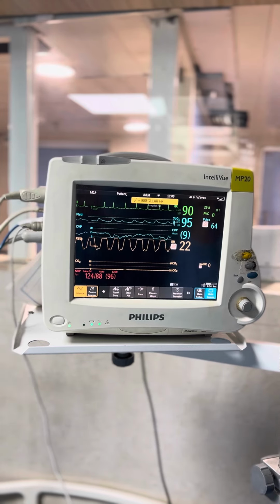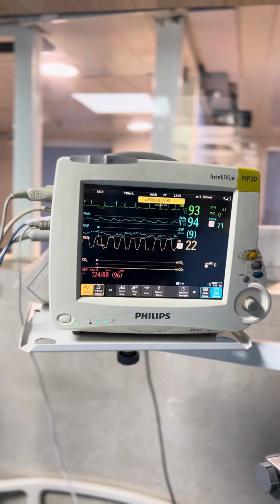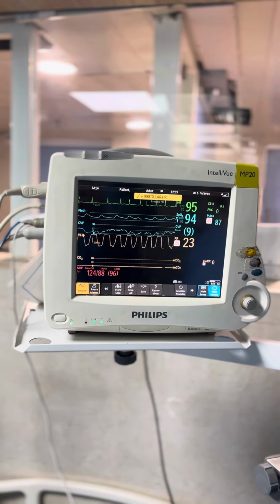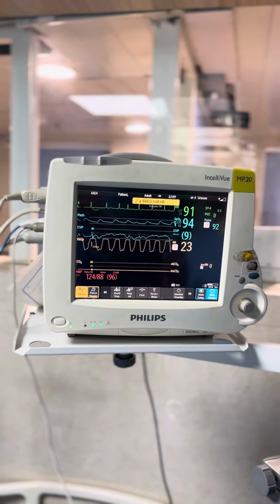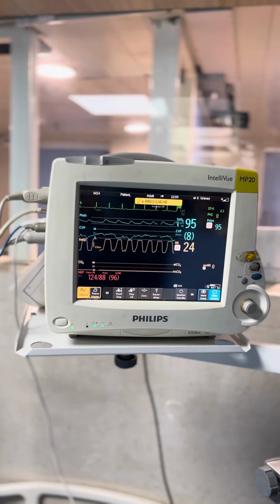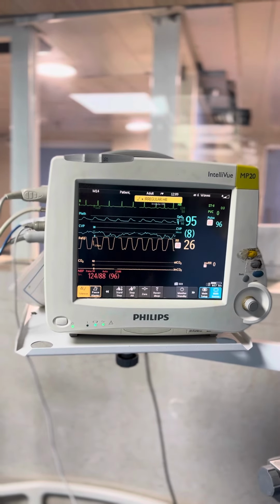In the previous ECG, we just talked about a normal ECG where a regular rhythm is there. I have put on a table and a chart board P, Q, R, S. Those are the normal waves which we see. Today, we will see an abnormal ECG.